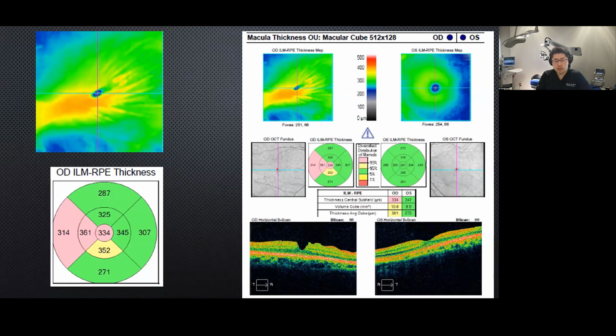One of the OCT modalities not commonly used is the retina thickness map. This is also very helpful in determining surgical planning. Especially in this case, you can see areas of epiretinal membrane, and based on this you can decide where to initiate your membrane peel procedure.